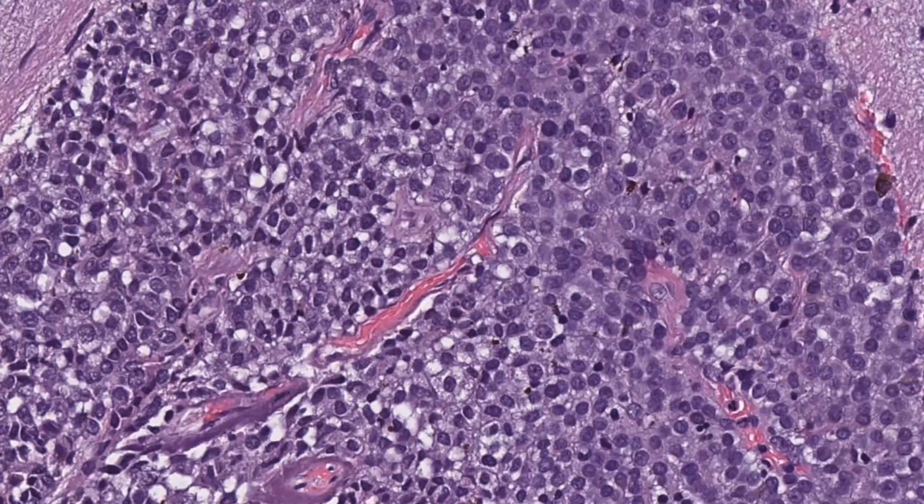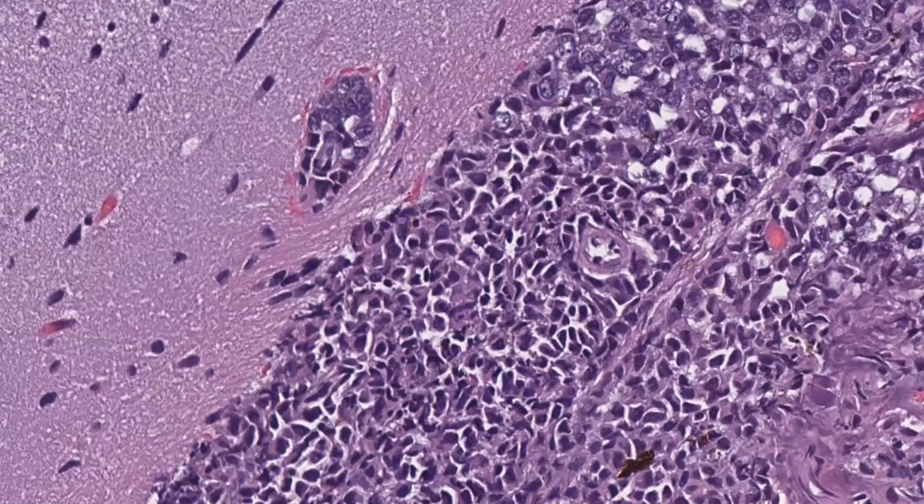Okay, here's another piece of the puzzle. I just showed you axial cuts, right? I didn't show you everything. There is no parenchymal disease. Nothing in the brain, per se, parenchymal. It's all 100% leptomeningeal disease. Well, leptomeningeal and what? What just showed up?